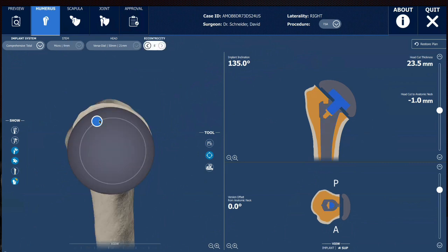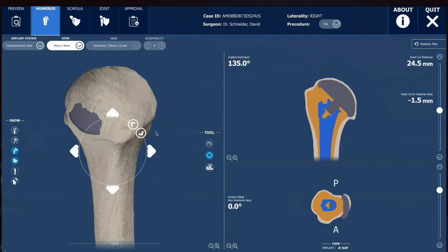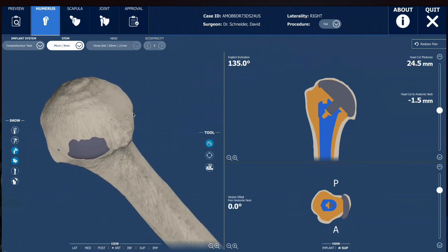But I'm looking at that eccentricity. I can spin it around, or I can decide maybe it's actually just a whisker too big. Or maybe I can lower it a little bit. See, I'm actually moving the stem over. I'm lowering the implant again. And then I can bring the bone back. Put it in movie mode and I can move it around.